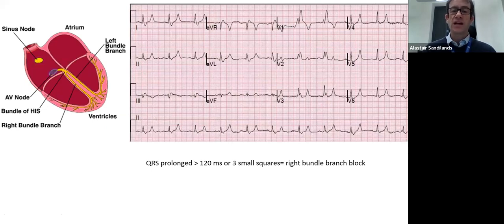Alternatively, we have another ECG now where there is prolongation of the QRS. You can see this most marked in V1. As I said, look in V1, we now see that all the signals in V1 go above the isoelectric line. If you see my cursor, this is the isoelectric line and it goes above. And you've got these bunny rabbit's ears now. In particular, a small bunny rabbit's ear and a big one. That is indicative of right bundle branch block.